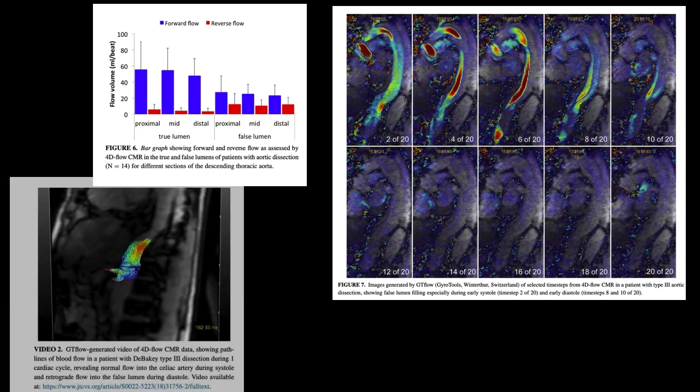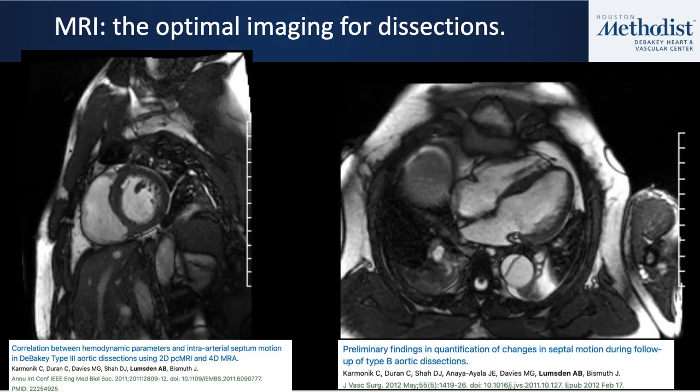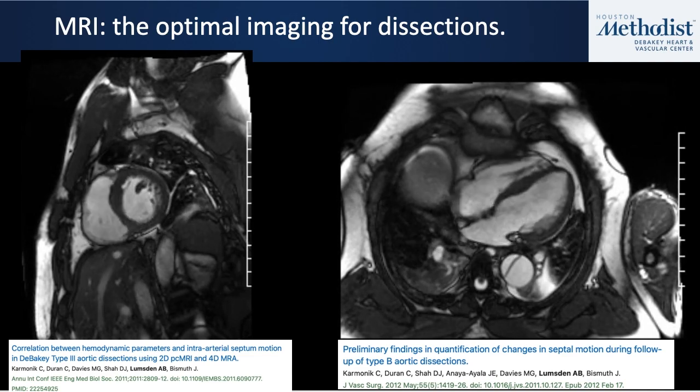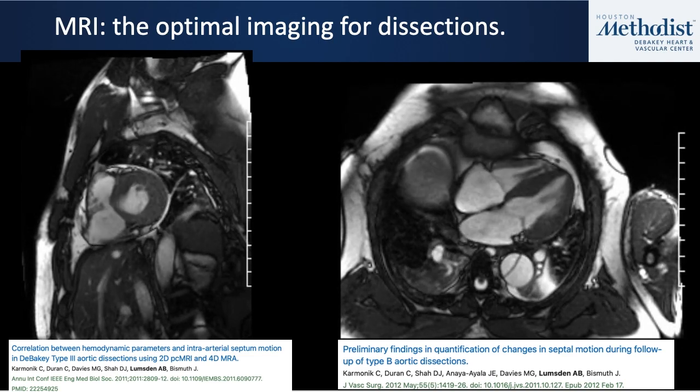And of course, obviously, the whole point of this is now to actually get into human observations. MR, of course, is widely used in the cardiac world. It's used for looking at valve function, wall motion function. You can see the flow in the descending thoracic aorta. And on the right, you can see in this same patient in these 4-chamber views, they've also got dissection.